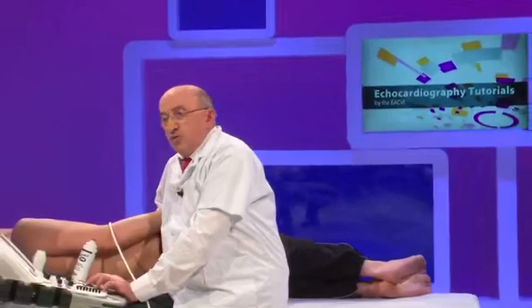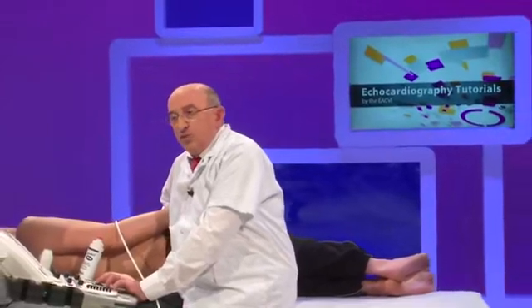And my final message is, when we are working on an infective endocarditis, we first have to begin with transthoracic echocardiography, but even in this patient, we will need to perform a transesophageal examination because some data may be better observed by transesophageal echocardiography, for example, the size of the vegetation and the presence of a small abscess.